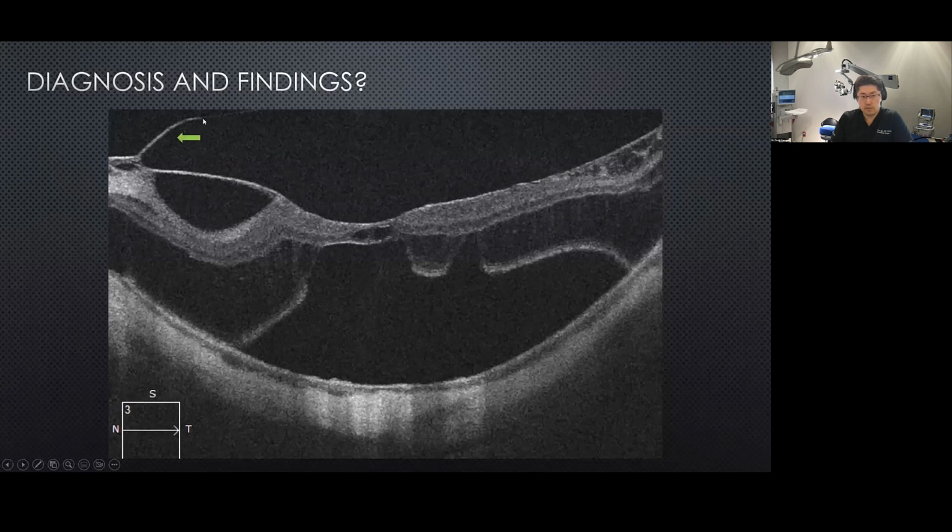Now, what we see here is macular or vitreoretinal traction, labeled by the green arrow, presence of epiretinal membrane causing corrugation on the retinal surface, intraretinal fluid over the fovea, presence of outer retinoschisis, inner retinoschisis, and as you compare the red arrow to the green arrow, you do not want to initiate your membrane peeling over the red arrow, because this is normal tissue, but with retinoschisis of the nerve fiber layer.